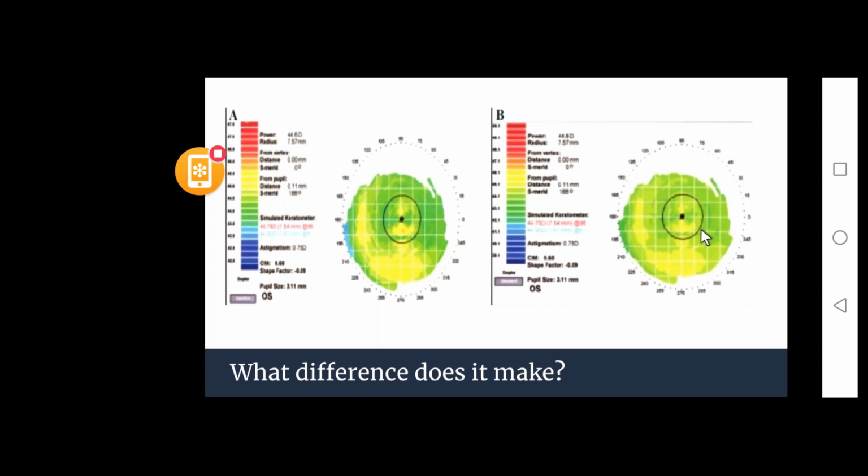Right. So the standard scale does not take into consideration the dioptric differences between the two points, and the normalized scale or the adaptive scale takes into consideration the minimum step between the two different points on the cornea. Right. So these are basically the scales.